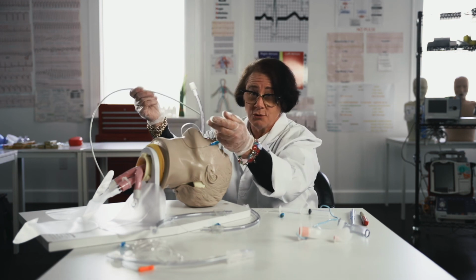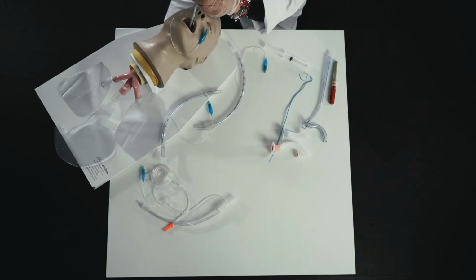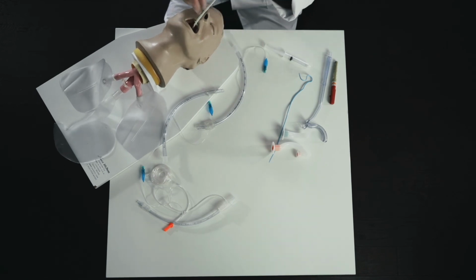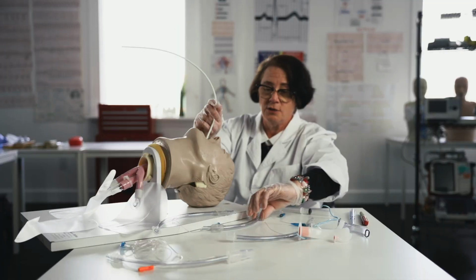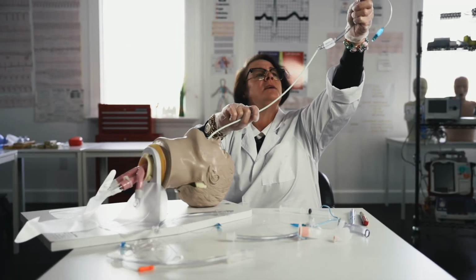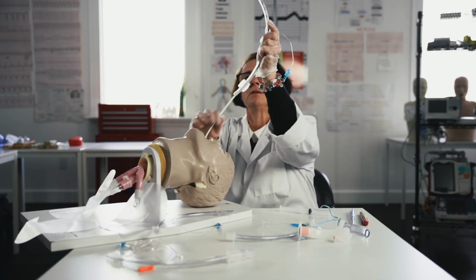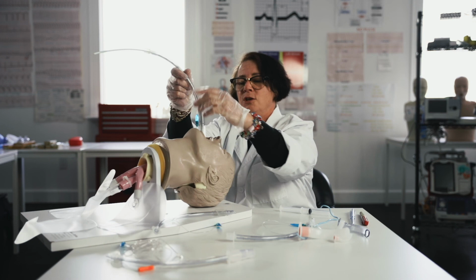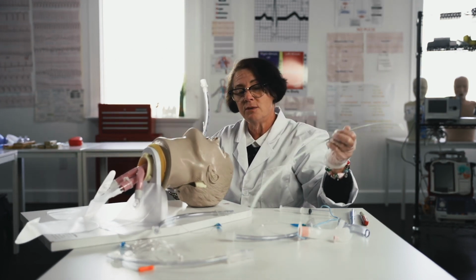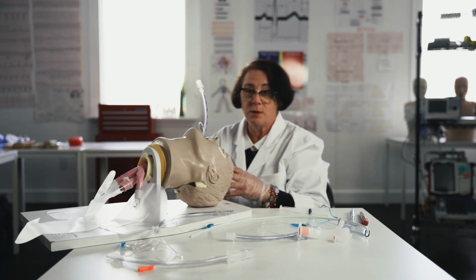So say this is a broken endotracheal tube or tracheostomy. They're going to float in the bougie. They know they're past the vocal cords, and pull out the broken endotracheal tube or airway, and they'll float in a nice new one right over it. So when in doubt, call anesthesia. They're the ones that typically place all these airways. And you can change out an airway over a bougie, similar to when we change out big central lines over wires, but we change out airways over bougies.